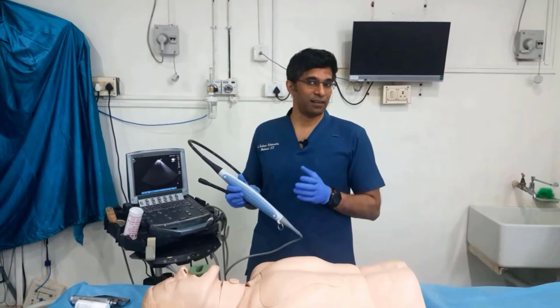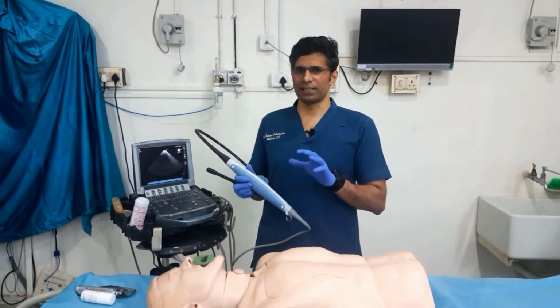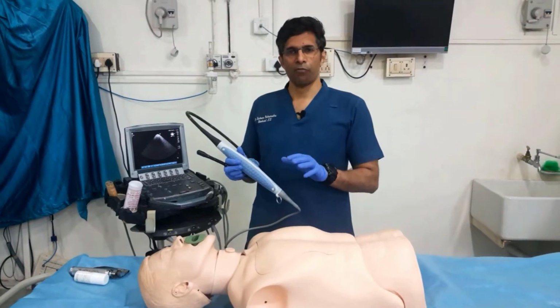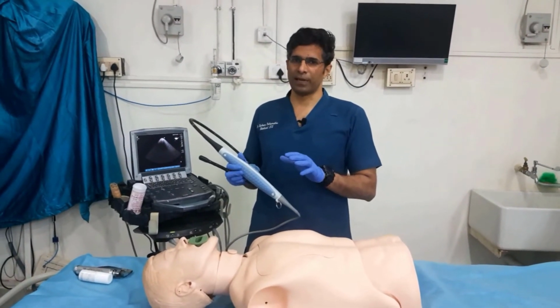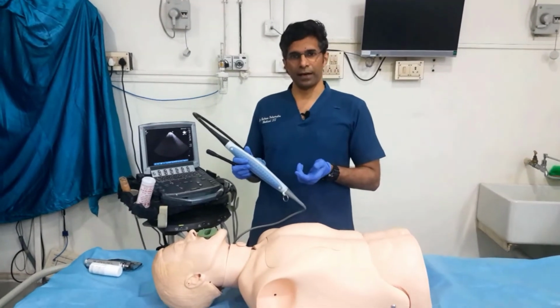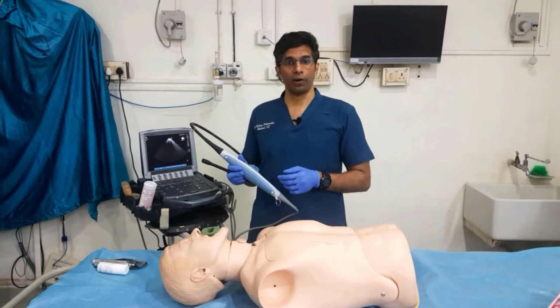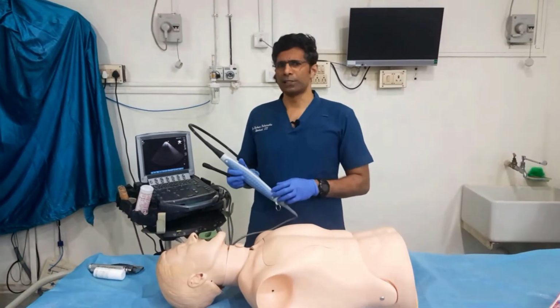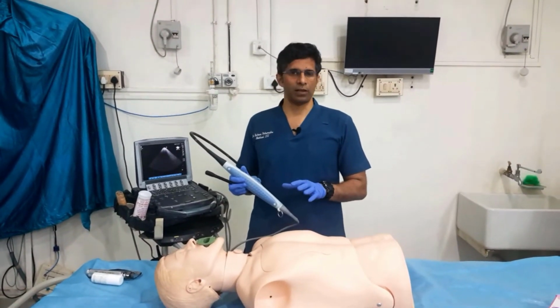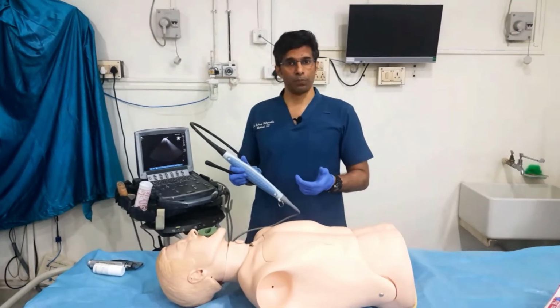There are 20 standard views of transesophageal echo, but today we'll just look at 6 or 7 essential views that are needed for assessing the hemodynamics of a patient in the ICU. The usual indications for transesophageal echo in the ICU would be to look for a cause of shock, especially when transthoracic views are not possible because of poor windows or because the patient is prone.